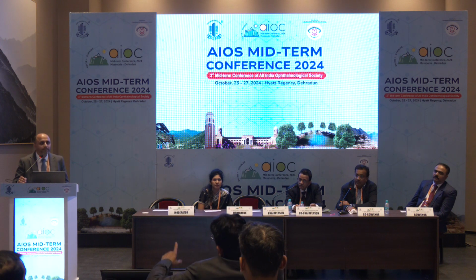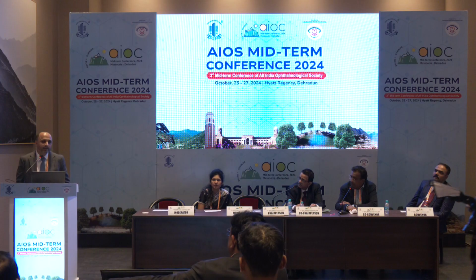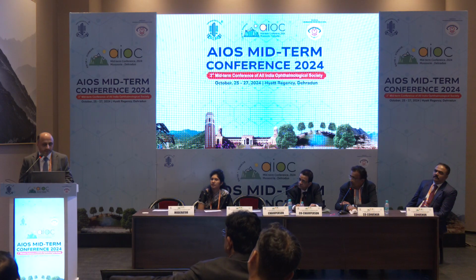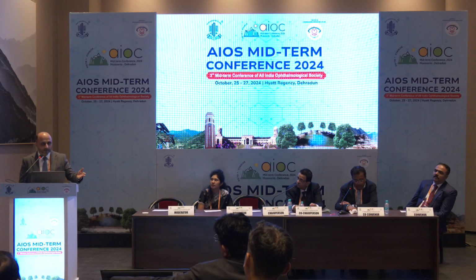Not at all, sir. It is not. It is just an additive, and it improves our understanding on certain things that we didn't have, like I showed IJT, and then even CSR. So it has totally changed CSR. I was asked a question once that, if you don't have an OCTA in one clinic and you have an OCTA in another clinic, what will you do? I said I would not shift other than for CSR, maybe.